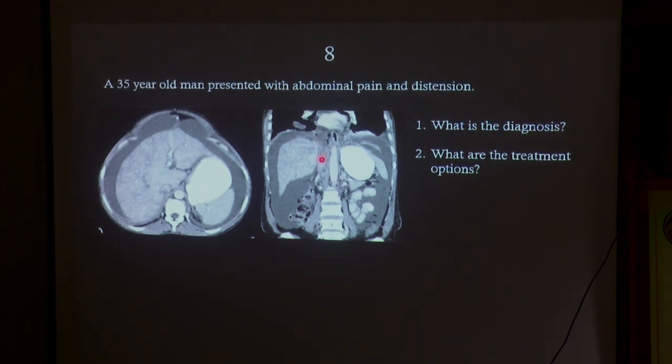Yes, good, Budd-Chiari syndrome. There will be acute and chronic forms. In the acute condition, what will be the imaging findings? In acute, there will be predominantly hepatomegaly, splenomegaly, and some heterogeneous liver parenchyma. Whereas in the chronic stage, there will be caudate lobe hypertrophy, large ascites, and on contrast enhancement, there will be early enhancement of the central liver around the caudate lobe with delayed enhancement of the periphery. In delayed phases, there will be enhancement of the periphery with central hypoenhancement, which is known as flip-flop appearance. So that is in the acute and chronic phase.